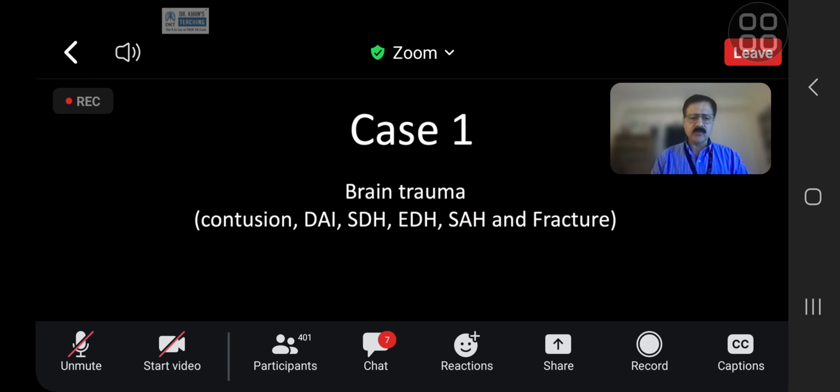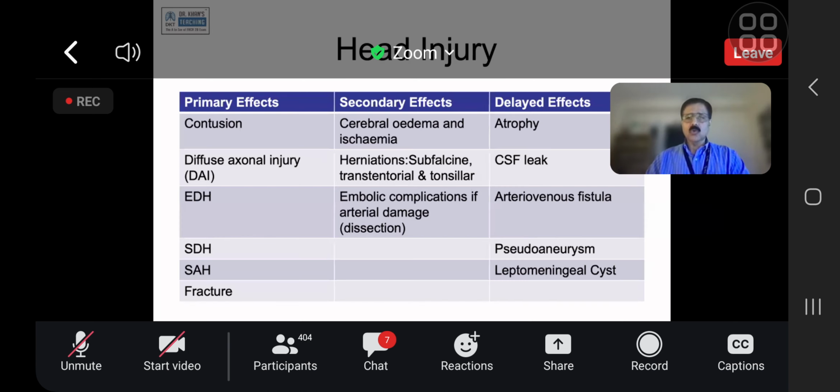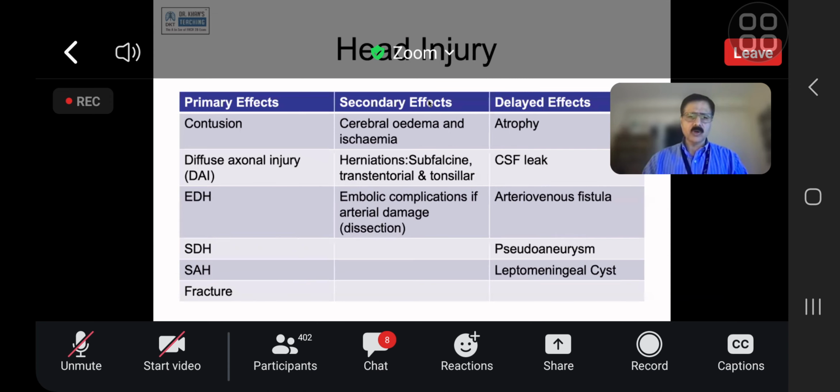We also have got a bit of herniation, bit of midline shift, etc. Now, all of these words and the concepts behind them should be known, and the marks are going to be, because there are many findings and it's easy to get those findings. But having said that, we should have a clear-cut concept of what to call what.